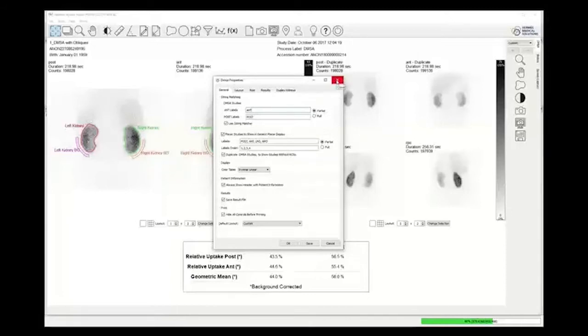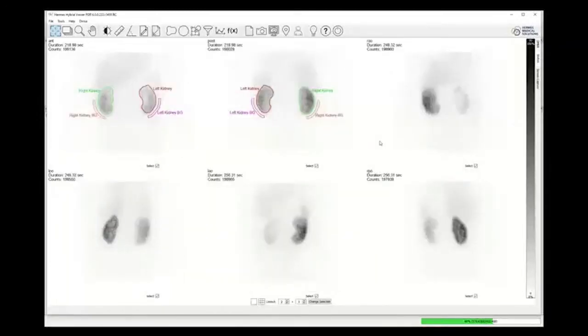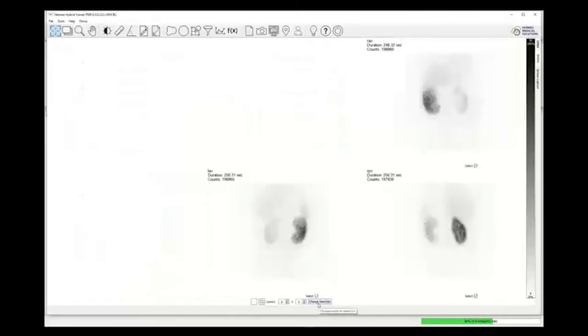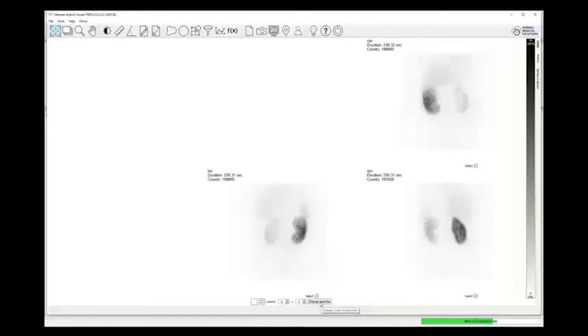So that's really nice. There also is a new option, which again is comparable to functionality that you would have seen in classic applications. So now when you want to disable an image, if you click on change selection, you can just do a double left click, which is much more comparable to what you're used to in your classic applications. So that's really nice. Obviously, a lot more efficient in terms of disabling unrequired images.